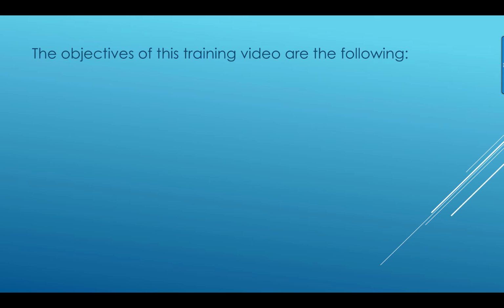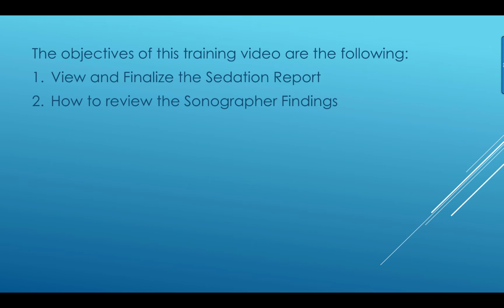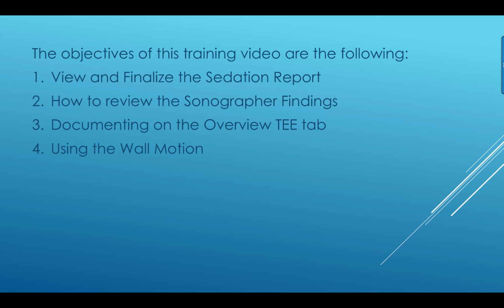The objectives of this training video are the following. 1. View and finalize the sedation report. 2. How to review the sonographer findings. 3. Documenting on the Overview TEE tab. 4. Using the wall motion.